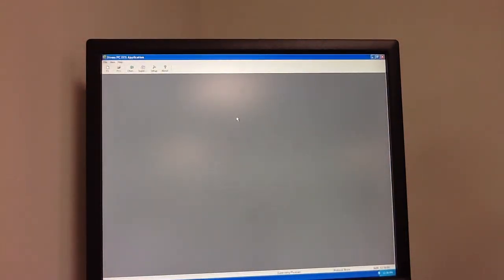So we double click that, and you'll see a number of menu icons here, and we just really want to worry about the F1 or the F11 button. And the F1 button is going to open a new study. The F11 button would open previous studies and the database for previous test subjects that we've done.